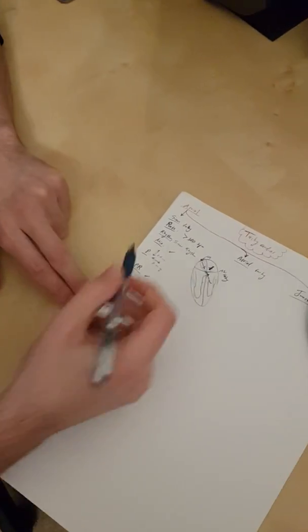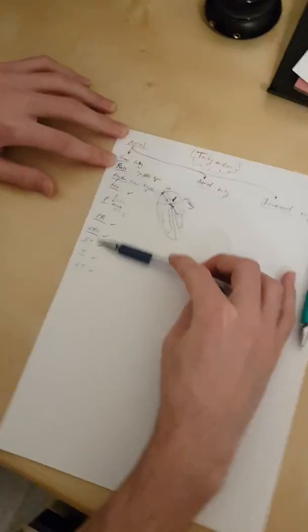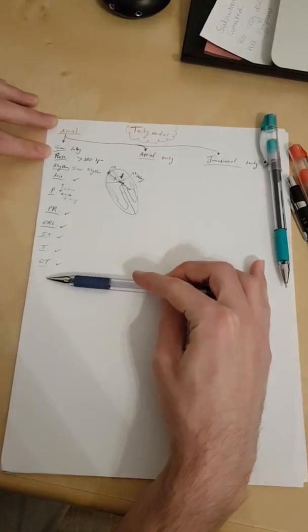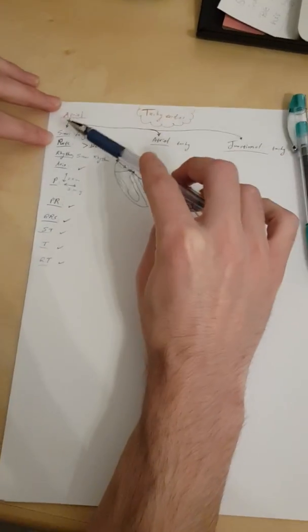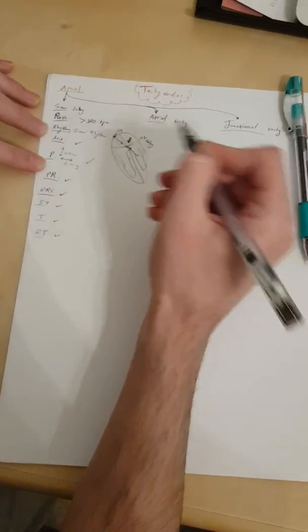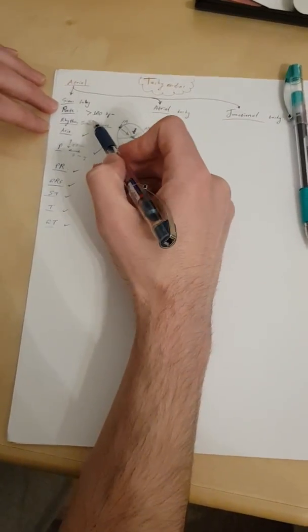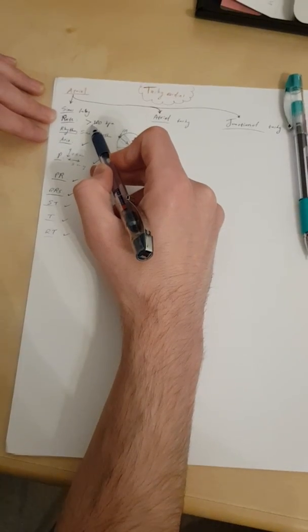All right. So this is it. When any of you analyzes an ECG with sinus tachy, you'll find nothing abnormal about it. By the way, the P wave, we said it's fine. So you'll find nothing abnormal about it, except the heart rate is fast.